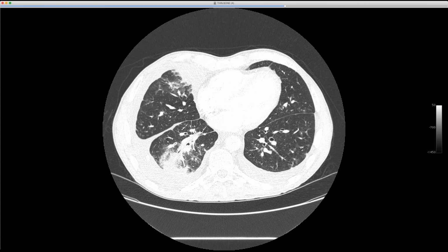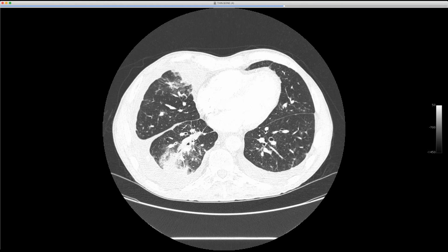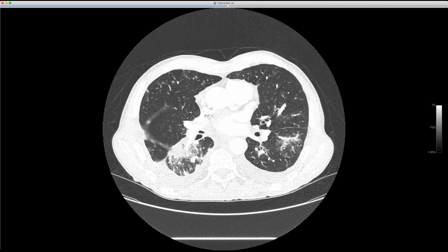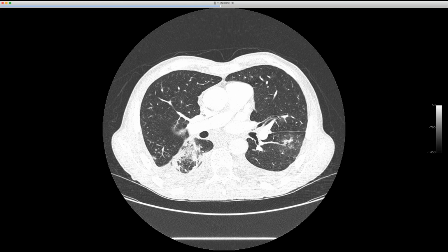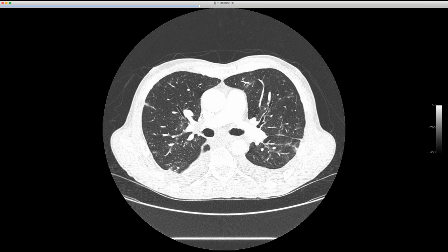I mean, this one has some of that. I think these are, and I should go back, the tumor's down here, it's growing up the bronchovascular bundle, and you can see there's mets, but I think these are all endovascular metastases, and then this hairy caterpillar I like is sort of a venous metastases, and you're seeing engorged side branches draining into these veins, because normally you don't see this many little side branches in any of these veins, especially that front.